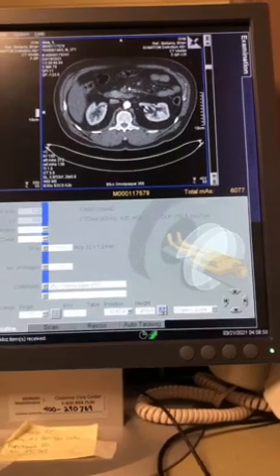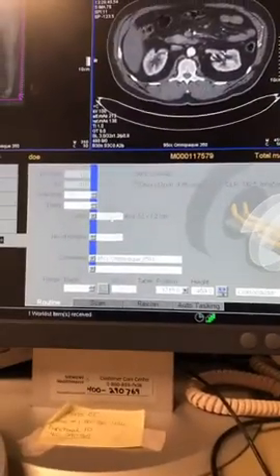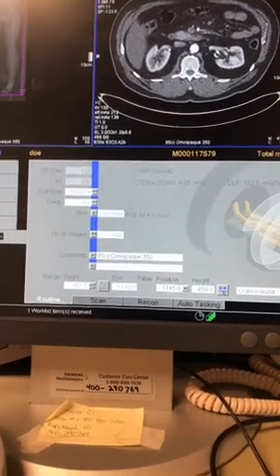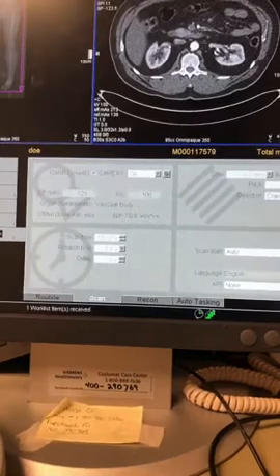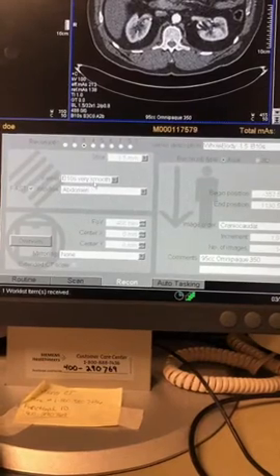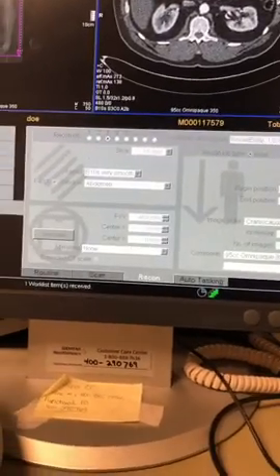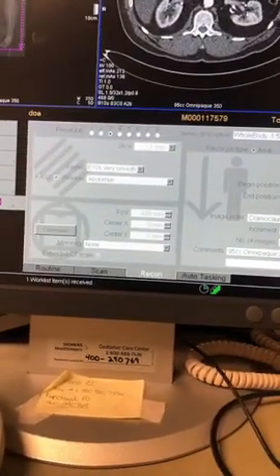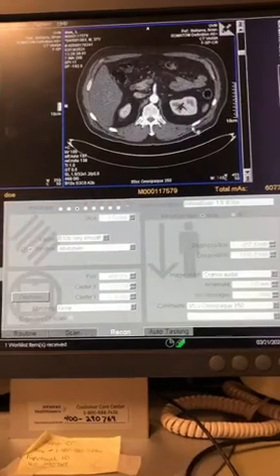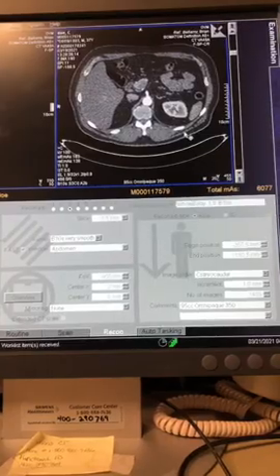All right, so we get our images. Let's look through some of this stuff here. We got 3mm slices, 95 cc's on this. On a CTA chest that's not a runoff, it's probably 80. But this is gonna be the same. So this is weird, right? We're at B30S very smooth. Remember, it was B30 for all the other ones, and this is on an abdomen. So take this with a grain of salt, since I don't have my protocol for the other one, that this isn't really counting. I just wanted you to be able to see this. So we're gonna pause, and I'm gonna jump into an emergency patient where I pull just the angio protocol.